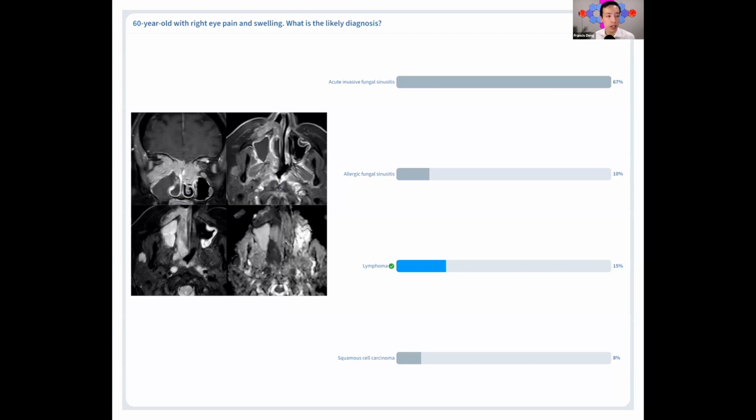You would see areas that are not quite as thick, and they would be hypoenhancing on post-contrast images. And while you may have infiltration of the premaxillary tissues and of the orbits and so forth, it would not be so mass-like like this case of lymphoma was. So this turned out to be a diffuse large B-cell lymphoma.